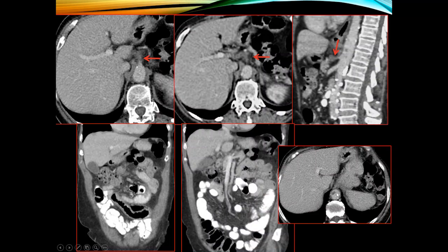You'll also notice in the aorta there's a filling defect. So unfortunately, this patient had a thromboembolic phenomenon, probably happening intermittently, and it caused celiac artery occlusion, as well as occlusion of branches of the SMA, leading to ischemia. So this is very important to recognize, and this is a very difficult case.